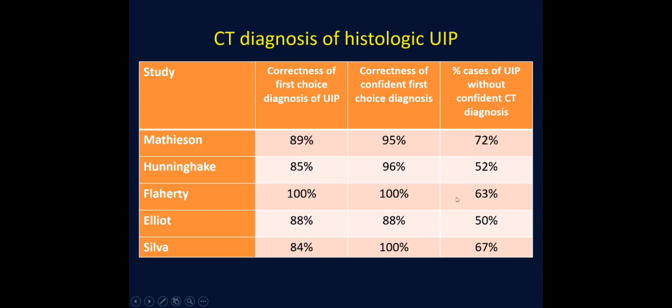However, you will notice that there is a substantial proportion of cases in which you are not able to make such a confident CT diagnosis. So you cannot expect to get every case right, but if you have a typical set of CT findings, you will usually be correct.